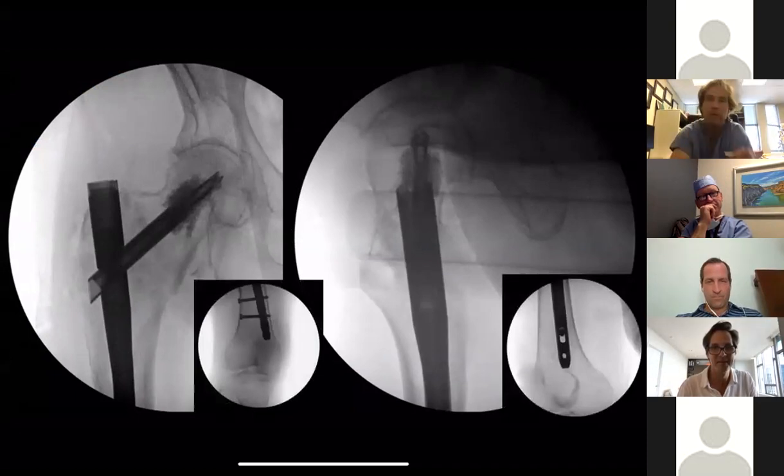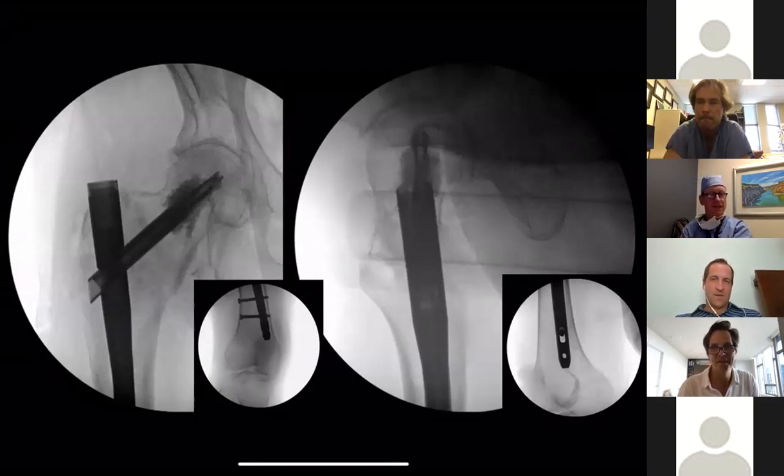And then I left the room and I said, just put in distal interlocks. Crazy. Now what do you think? Oh, that rotation is heartbreaking. Mm-hmm. Well, and you know what's interesting? If you had used a short nail, you would never even have had it. No idea. You wouldn't have known it was that way. Yeah. No idea, right?